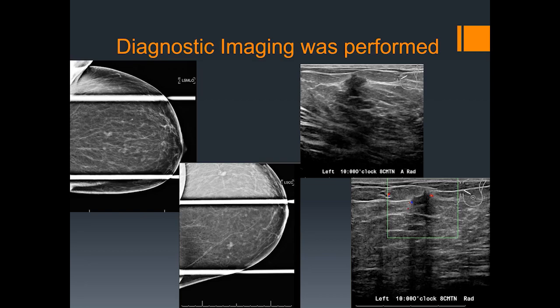These 2 ultrasound images were obtained showing the distance from the nipple, showing the clock code, and then the radial and anti-radial, all as a standard part of quality assurance as we discuss and think about ultrasound images. In both of these images, we show an antiparallel hypoechoic mass with subtle peripheral vascularity and an irregular margin.